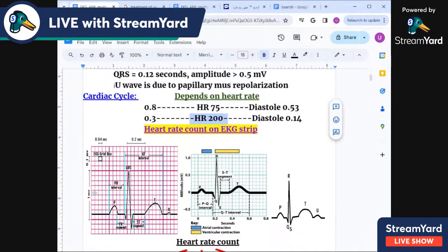Vertically, the smallest square is 0.1 millivolt. It gives you the voltage. Two smallest squares is 0.2 millivolts, and 10 small squares make 1 millivolt. So if you see here, the duration of P is 3 smallest squares, almost 3.